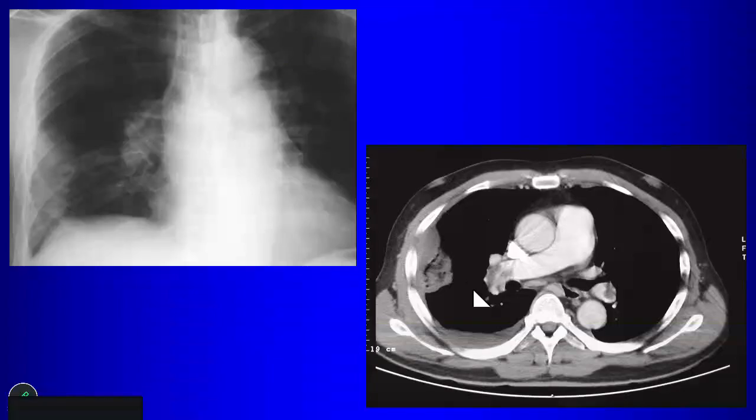All right, so consolidation and peripheral consolidation in somebody with pulmonary infarct. There are two possibilities actually when you have a peripheral consolidation like this in somebody with a pulmonary embolism. What are the two possibilities? You mentioned one, which is infarct. What's the second? Hemorrhage. How do you differentiate them? You really can't on the initial CT, but what happens on follow-ups?